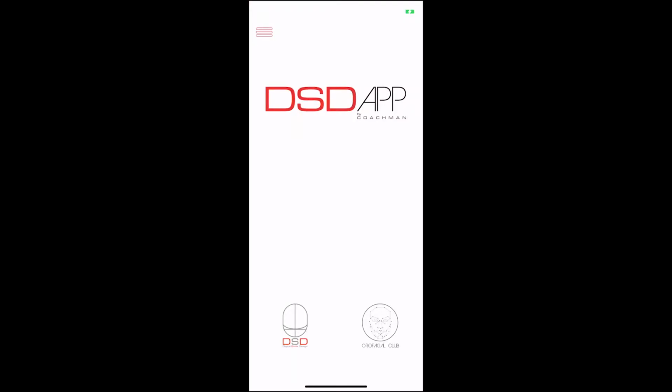When designing a smile, you are already opening up your vision to what treatment options you can offer to your patient. When adding an intraoral scan to your design, you will bring more accuracy to the digital planning, as the intraoral scan is a copy of the patient's maxilla. And once superimposed over the patient's picture, you will be able to visualize the patient's entire current conditions, even if the lips are covering the teeth.